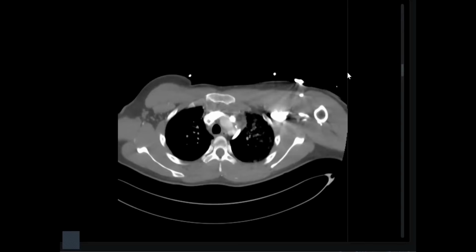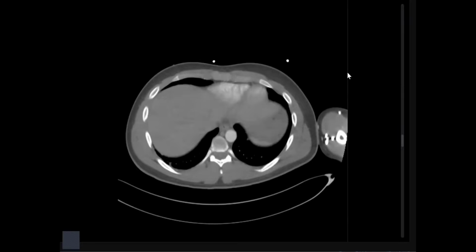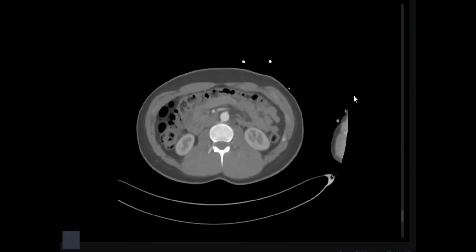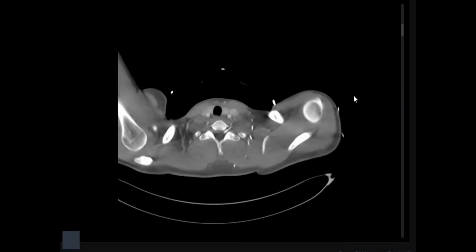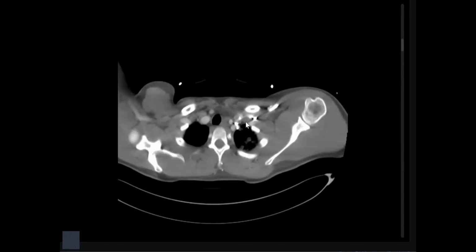Thank you. So I'm scrolling through the CT scan axial section contrast image of the chest. I will take a moment to scroll through the findings and then go to the last cut. And now coming back, I'm scrolling back again. So here I notice, in the left lung, there is some filling defect in the vessels.